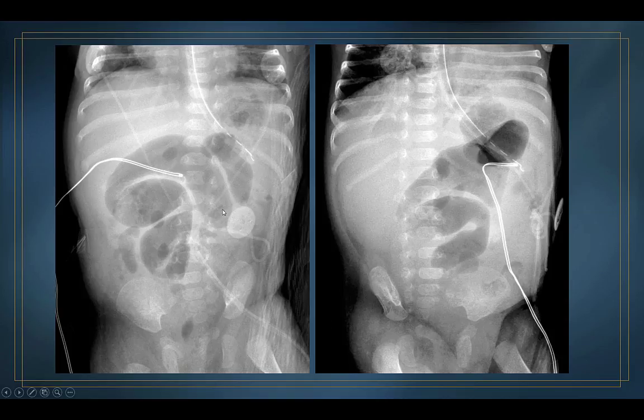An even more dramatic example, this is a baby with NEC that developed a fixed loop, and these are two different decubitus films pretty much a day apart. And if you'll notice, on this decubitus film he's turned to the right, and on this decubitus film he's turned to the left. And when you turn to the right, the properitoneal fat will be thinner, and when you're turned way to the left, the properitoneal fat will be wider or thicker, if you will. There is no evidence of a pneumoperitoneum on this patient.